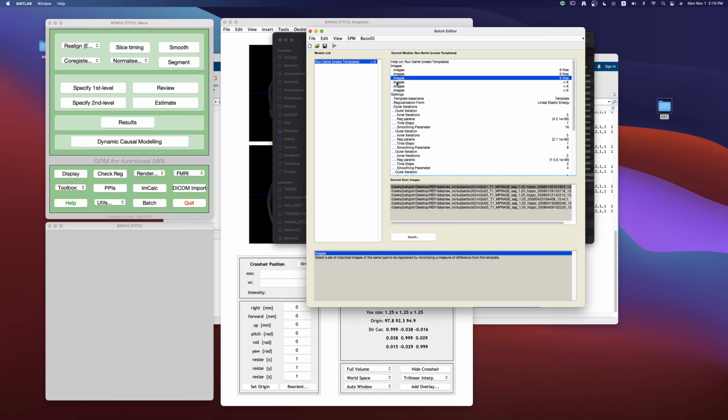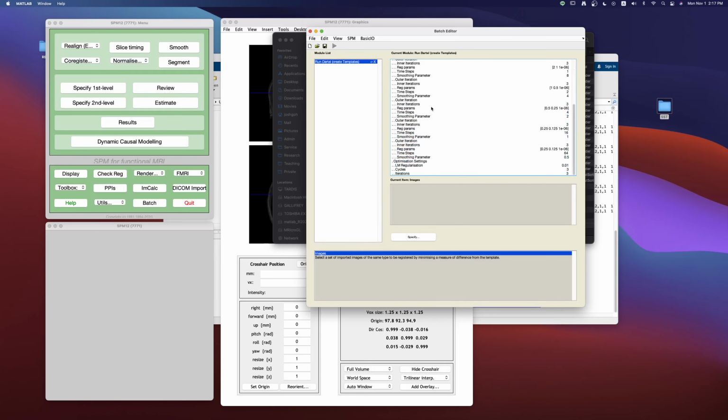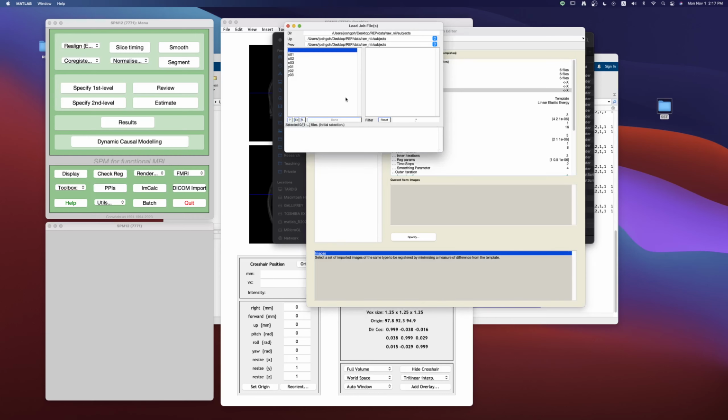I'm just going to preload this, and you have to do the same thing for the RC4, RC5, and RC6 images. I will just go ahead and preload this because I've done it before. It's too tedious to click all the way through again since I've already done it.